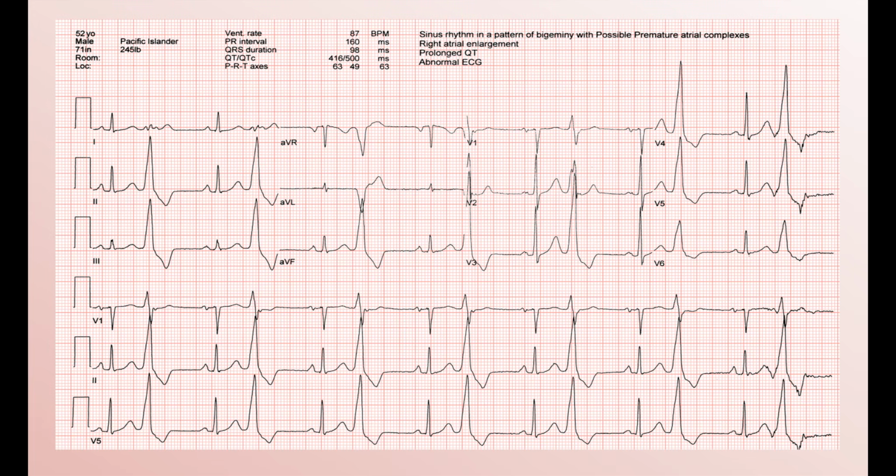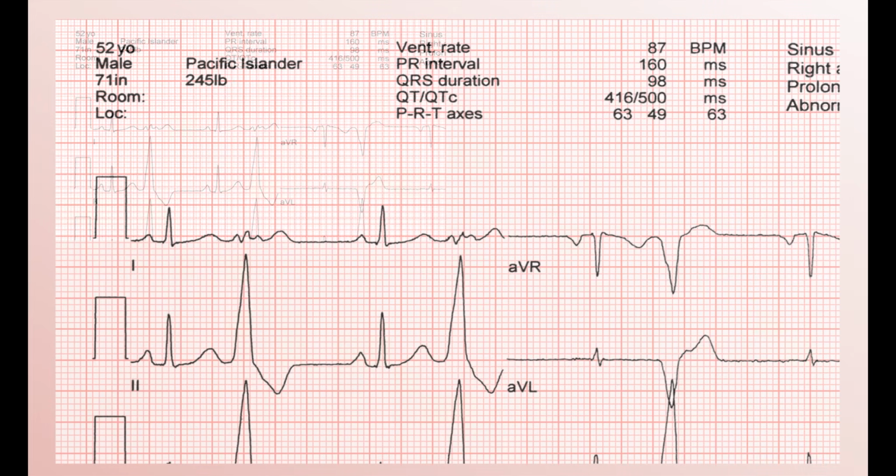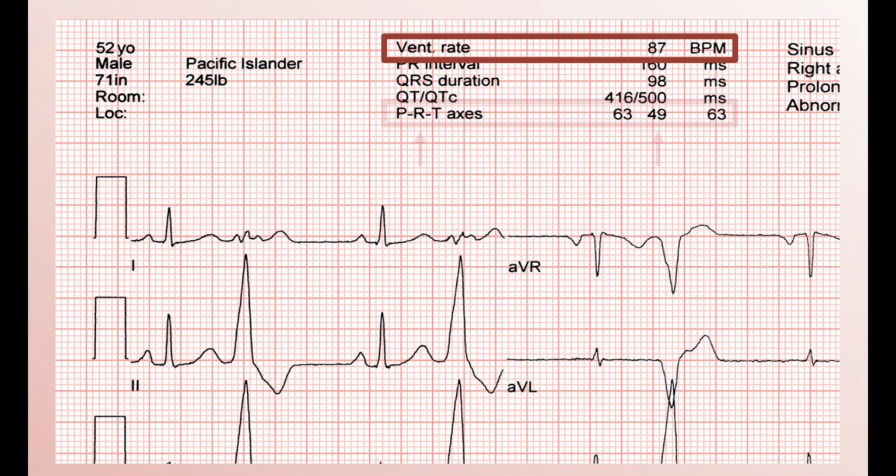This is because modern EKG machines contain a computer algorithm that will automatically calculate the rate and QRS axis and include these values on the EKG printout. They are almost always located in the upper left, where the QRS axis is denoted by this middle number here. The adjacent numbers refer to the P and T wave axes.